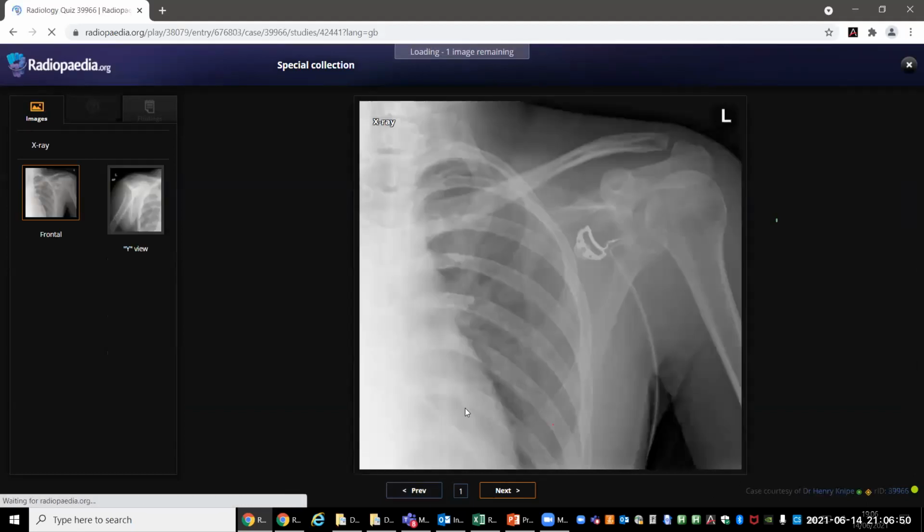For this one, you could have asked for history. There's nothing wrong with the medial end of the clavicle. If I told you that this was a case of trauma, would it help? Well, I haven't seen any fracture, maybe because of my excitement, but I'm looking again at the ribs and clavicle. Can you help me in this matter?